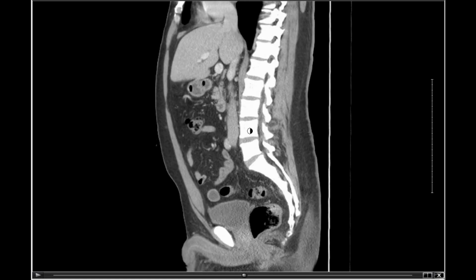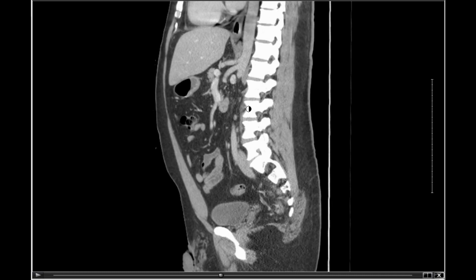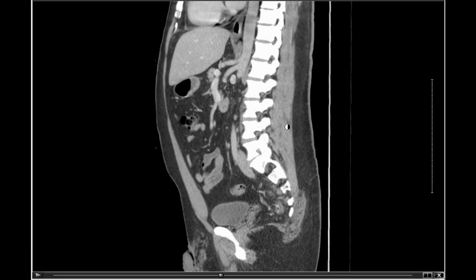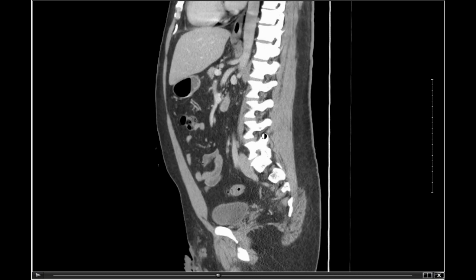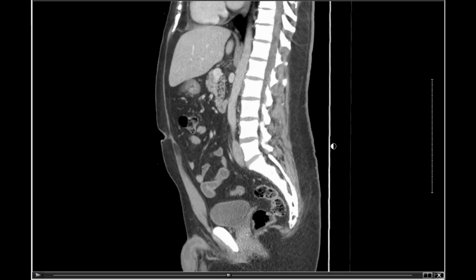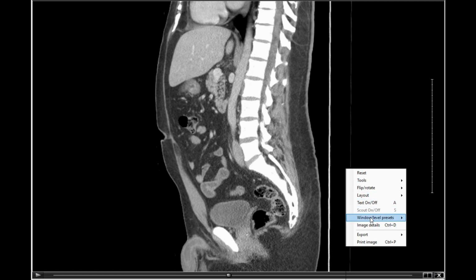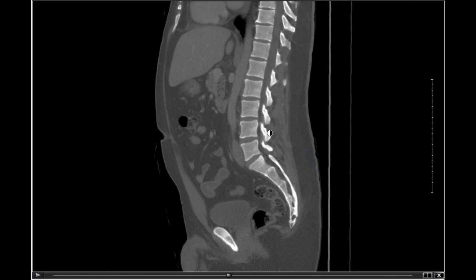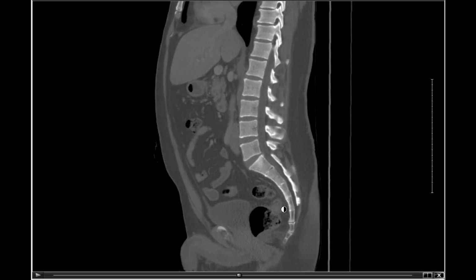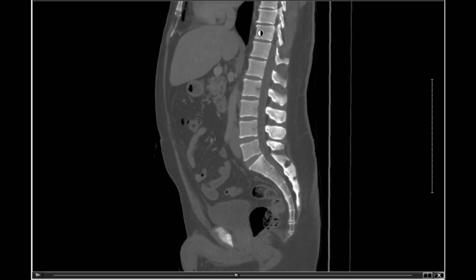And before we go any further, though, let's take a look at the bones here, because we got this nice big vertebral column to examine. So a lot of muscle flanking it, the erector spinae and transversus spinalis muscles on its posterior aspect. Here we got the vertebral bodies. Let's do a little bit of fiddling around with the presets here, so you can see the bone a little more clearly. So right here we have the sacrum, the spinal canal, got my coccyx tailbone hanging out right there, pubic symphysis right there, and here can see the different vertebral bodies and the spinous processes.